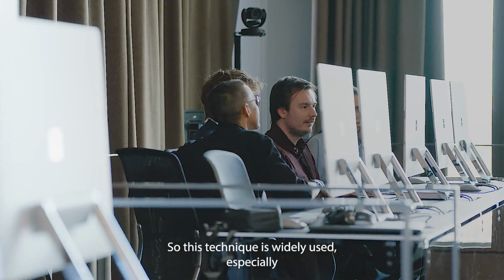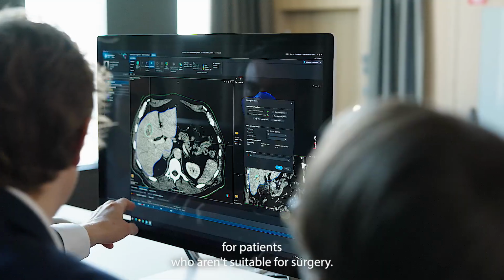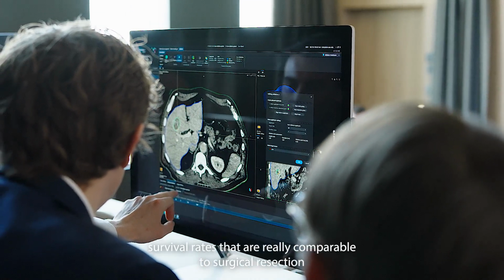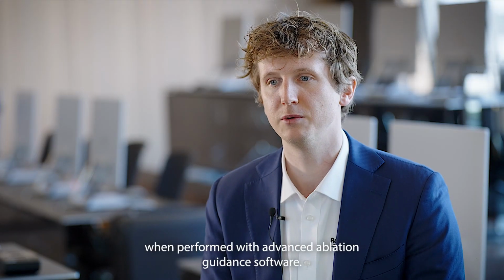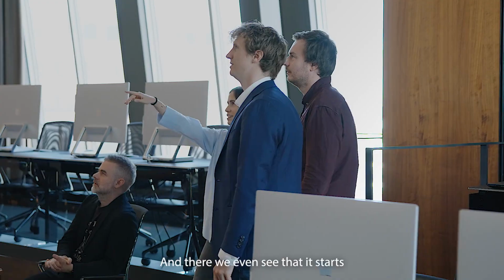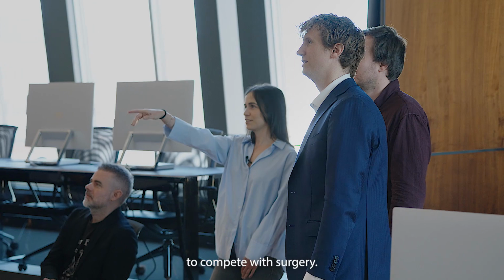So this technique is widely used, especially for patients who aren't suitable for surgery, and there it demonstrates survival rates that are really comparable to surgical resection when performed with advanced ablation guidance software. And there we even see that it starts to compete with surgery.